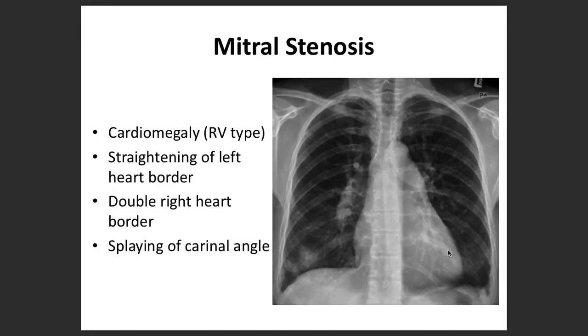What happens is, in mitral stenosis, not only is there severe enlargement of the left atrium, okay, but mostly the LA is the one which is really enlarged in fact, and that is where the problem happens. And due to the pulmonary congestion, it may also lead to the RV enlargement as well. Okay, so that is what is characteristic of mitral stenosis.